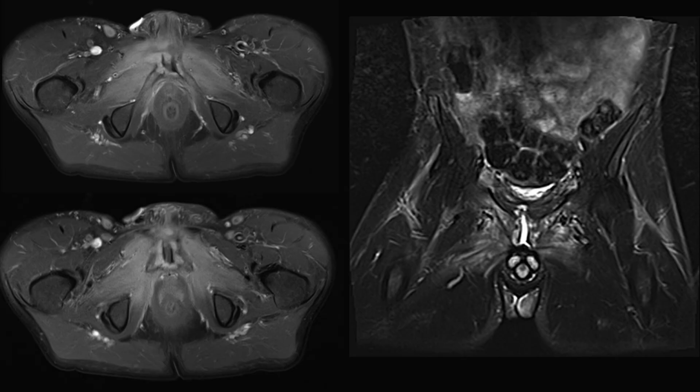Now, the MR pubis gives us more clues. We see high STIR signal within the pubic rami, along with fluid signal in the symphysis pubis joint. That's not normal. Additionally, there's bone marrow enhancement centered around the symphysis, with soft tissue extension on the right side, consistent with a phlegmon again. Surrounding soft tissue also shows high signal, indicating edema in the adductor muscles on both sides. So what we're looking at here is septic arthritis of the symphysis pubis with underlying osteomyelitis in the pubic rami.